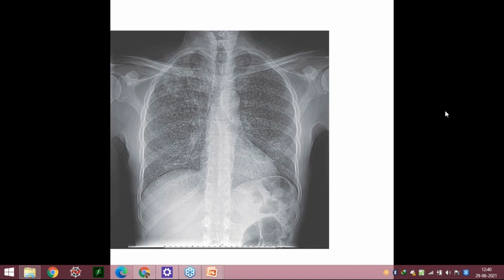Vasculitis is the correct answer. Chemical inhalation will have a different sort of picture. It would be chemical pneumonitis. Sarcoid is one of the differentials, but it is very unlikely to have a sarcoid with such a diffuse involvement. It is vasculitis, basically. Wegener's commonly can present like this, or for that matter, any vasculitis can present as diffuse alveolar hemorrhage. SLE can present as diffuse alveolar hemorrhage. Wegener's do present, and if you search the literature, you may find a few case series.